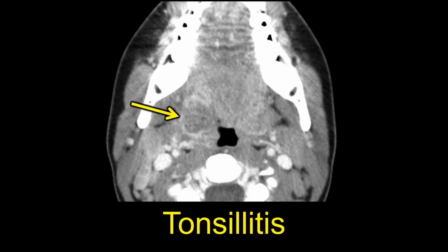And we can apply the same thing to the palatine or faucial tonsils. So here we see the palatine tonsils on both sides are a little prominent. This is an axial post-contrasted CT. So this is a CT scanner, so we're looking at densities of stuff. Remember that a CT scanner is just a big, stupid densometer. We're looking at densities of stuff. Bone is dense, it's very white. Air is not dense, it's black. Everything else is in between.